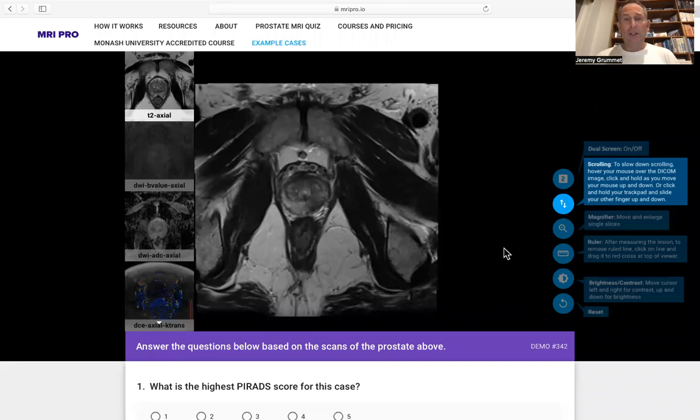And I wanted to share this short video with you to run you through how to actually drive the image viewer on MRI PRO. So if you go to the home page, you can click on example cases up on the banner here, and that will lead you to the page that you're looking at now.